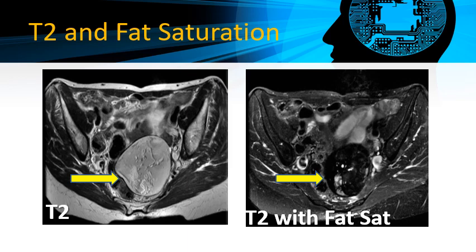This means that this lesion has a fat component, and usually it is an adnexal lesion, so we can characterize and narrow our differential diagnosis to a fat-containing adnexal lesion, and the most common situation in this case is a dermoid lesion. So from here we can characterize the pattern of the lesion and make a suitable diagnosis.